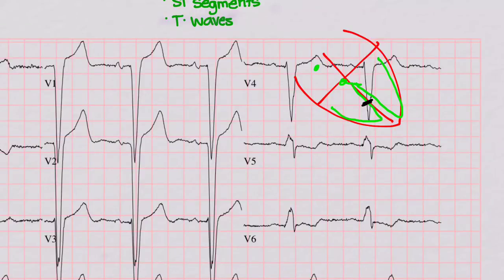So it's going to, in this case, I broke the right one. And so it's going to get here and stop, and now it's got to meander slowly through the heart because it can't go through these superconducting, super fast wires. But the left side can go fast. Similarly, you can have the opposite happen, where you have a break in the left side. So the right side can depolarize quickly, the left side stops, and it's got to slowly meander through the ventricle. So you're going to have a picture that looks like the first part going fast, the right side going fast, and the left side slow.